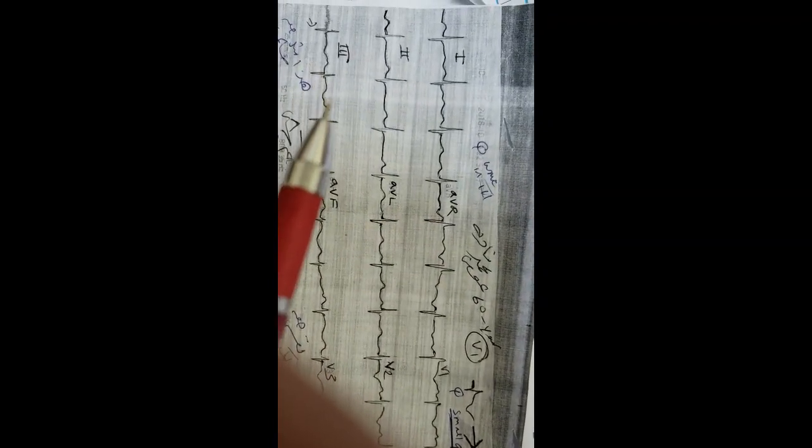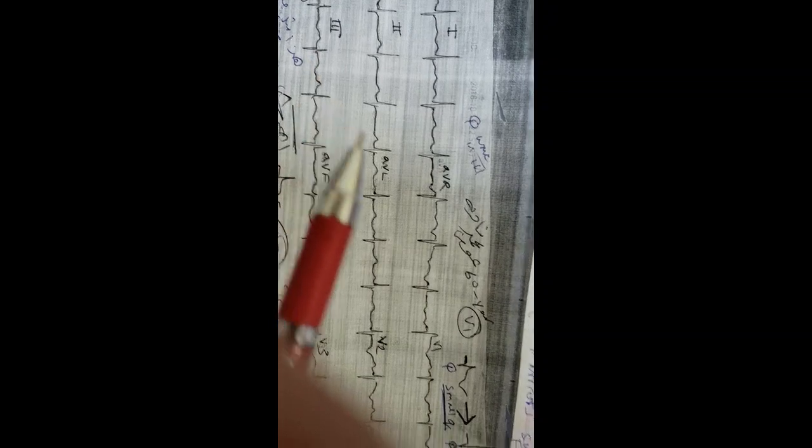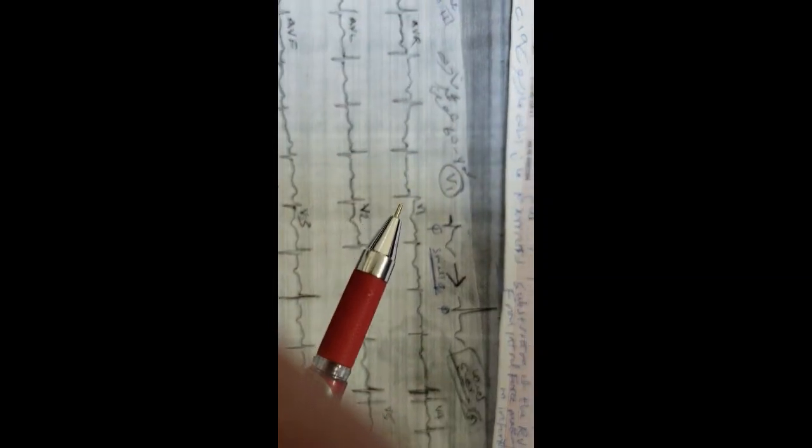This is the EKG on the second day with Q wave in the inferior leads, lead 3, and T-wave inversion and ST segment elevation, and in V1, with the heart rate relatively less than on the first day. And this is the EKG of the third day.